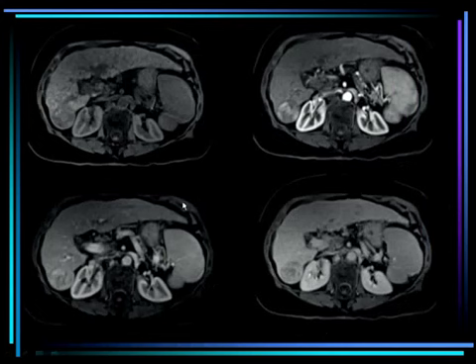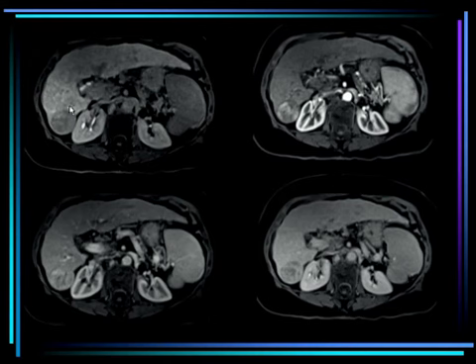And if you inject the hepatocellular contrast agent, this is the non-enhanced, this is the arterial phase with hypervascularization, this is the venous phase, this is the so-called wash-out phase, and if you have enhancement and wash-out, you are sure that you are dealing with hepatocellular carcinoma. And this is the 20 minutes where it demonstrates hepatocyte activity in the liver and no activity in this lesion. So, for the detection of hepatocellular carcinoma, you need by CT or MRI, and we're going to talk in the workshop about that, at least 2 phases or 3 phases.